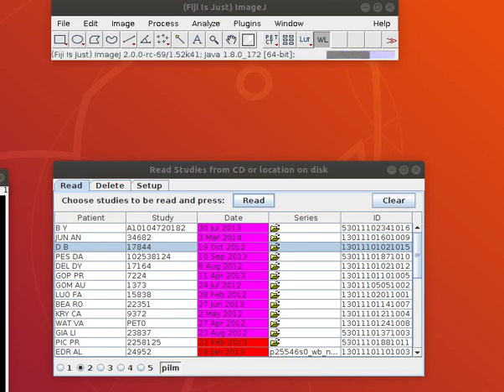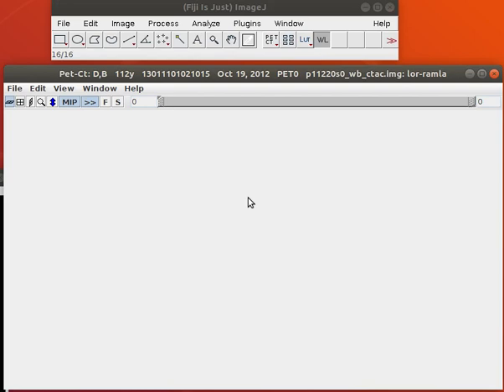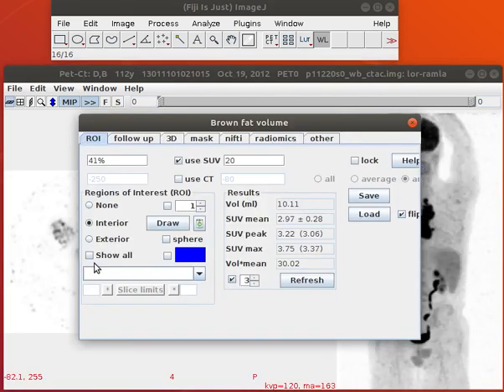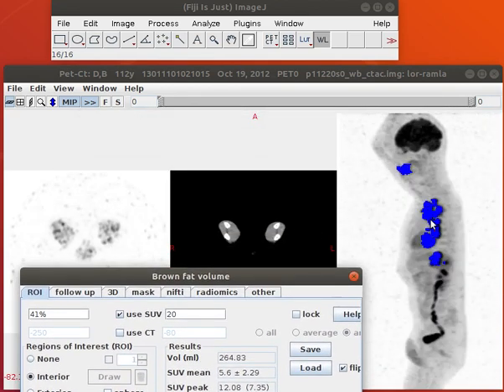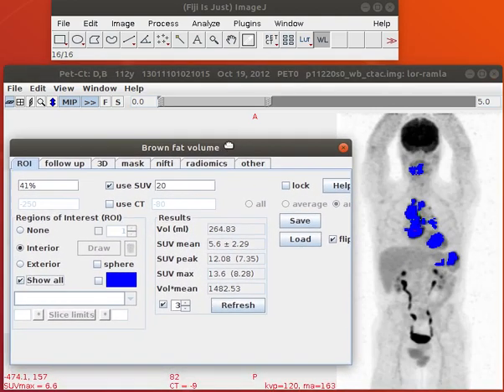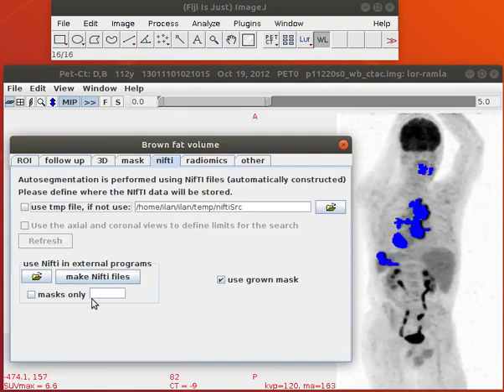This is actually generating redundant data because all the information is contained in the original data plus the mask files, the files which show which were the blue dots, which was tumor and which wasn't. Here, let me show what's in here. And here you can see the files. Now I want to go into the Nifty file, and this is what I want to use.